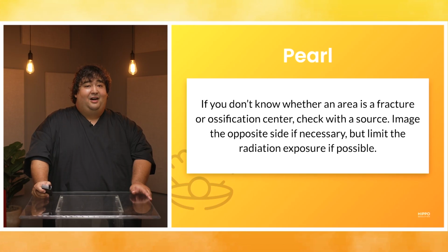Okay, so again, we talked about this quite a bit, but if there's an area of concern and you're not sure if it's a fracture or an ossification center, know that there are some references out there that you can look it up in, or get the contralateral side if you need to. Cool.